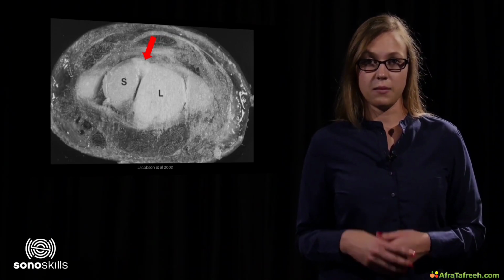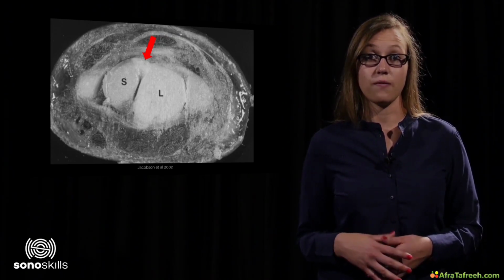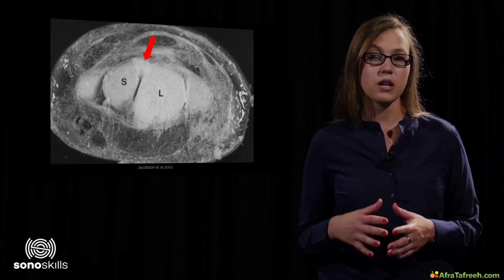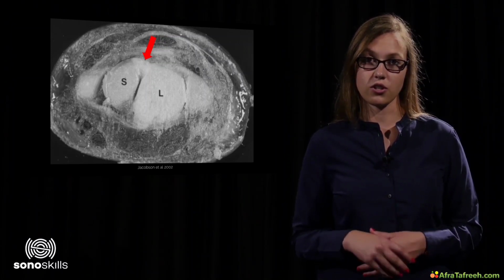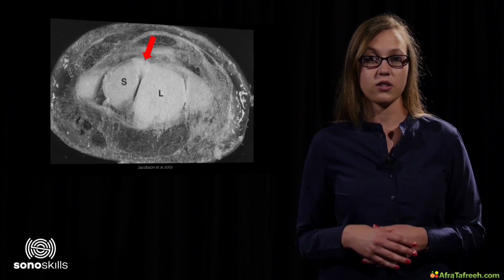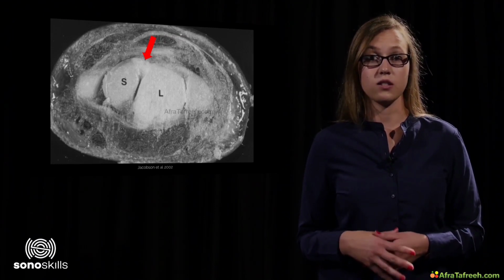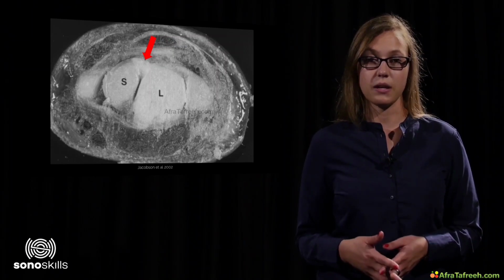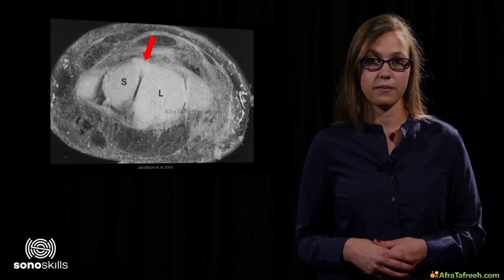In ultrasound images, the dorsal aspect of a healthy scapholunate ligament appears as a hyperechoic and fibrillar structure. Hypoechogenicity, discontinuity, or absence of such a structure indicates disruption of the dorsal aspect of the scapholunate ligament.